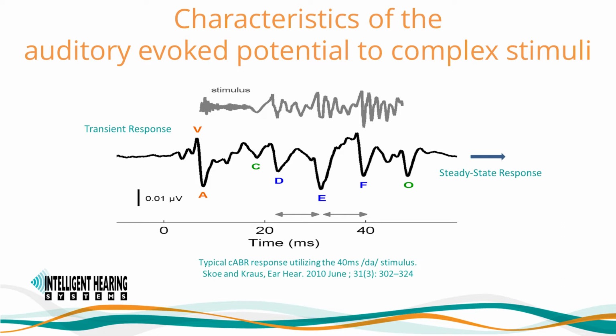The stimulus is delivered at time 0, but there is a neural lag or delay before the response occurs. The stimulus shown on the top panel is thus shifted in this image to compensate for the delay shift and to demonstrate how the stimulus lines up with the response.